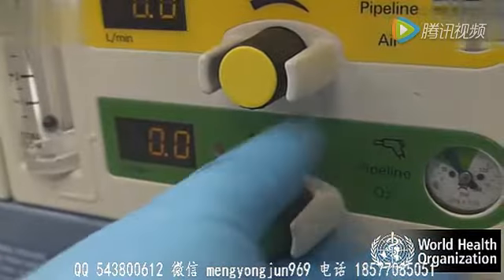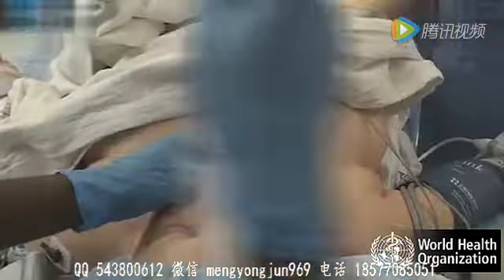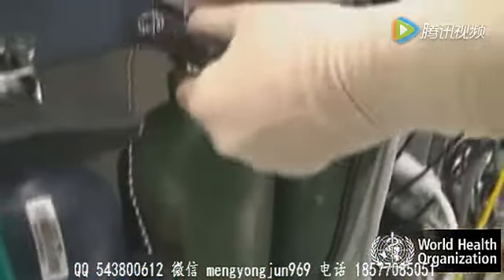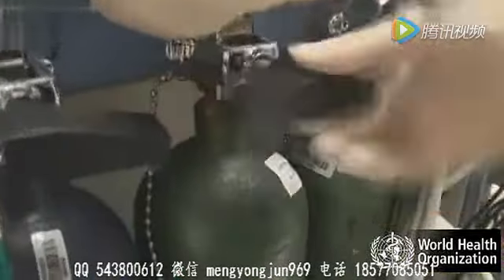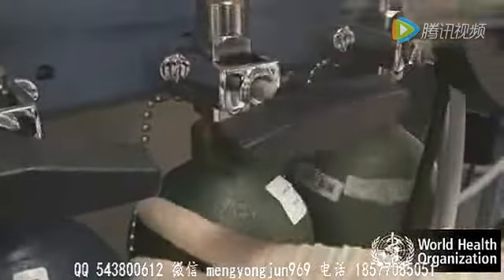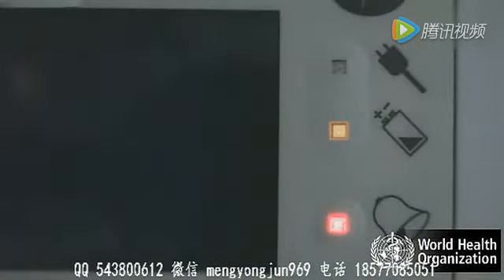Equipment. Problems with the anesthetic equipment may include disconnection or obstruction of the breathing circuit. Problems with oxygen supply may include an empty cylinder or oxygen concentrator not working. Problems with the monitoring equipment may include a battery failure in the oximeter or a faulty probe.